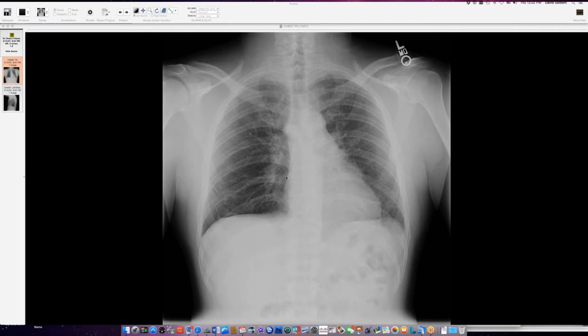This was a patient with sickle cell anemia, and he came to our emergency room with obvious drug-seeking behavior. This man actually travels around the country going from ER to ER asking for intravenous Demerol. And so this is actually metallic mercury here from mercury injection. Somebody had installed a PICC for his venous access. He said it was installed by a hematologist in Tennessee, but there was no documentation that was the case. So this man likes to inject metallic mercury, probably from thermometers.